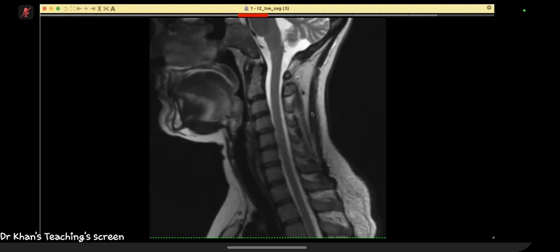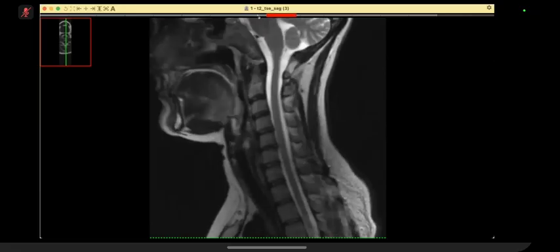Yes, I'm presented by a sagittal MR examination of the cervical spine. I am at the level of the mid sagittal. I'm focusing on the craniocervical junction, which looks normal. There is some degenerative disc disease. I'm trying to scroll. Yes, I'm sorry, there is some lag. There is no tonsillar herniation.